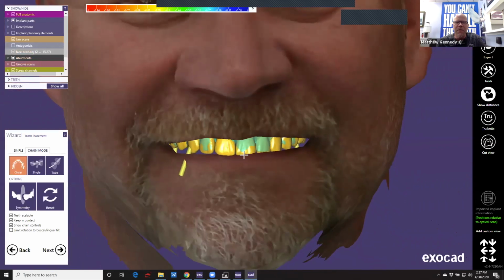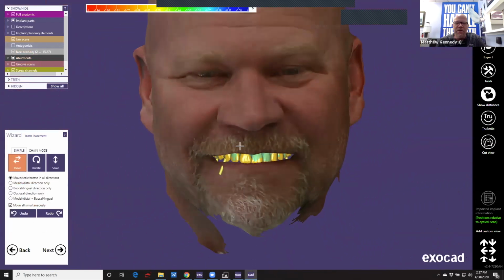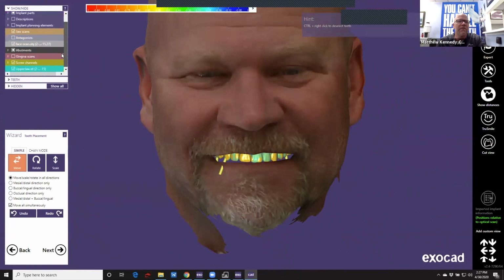So here we go. Got the face on there. You're looking. Let's move that up a little bit. Okay, somewhere around there. Get rid of this pre-op.